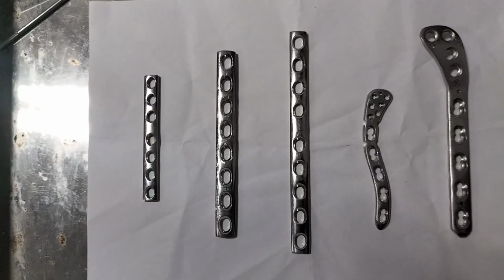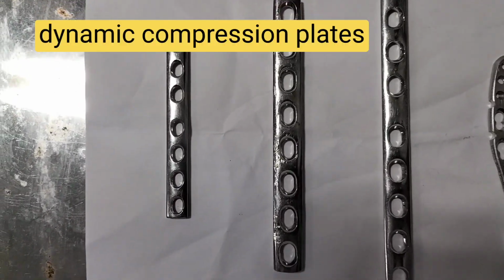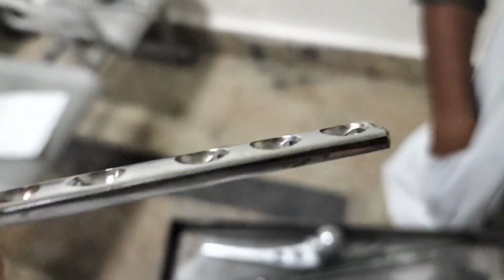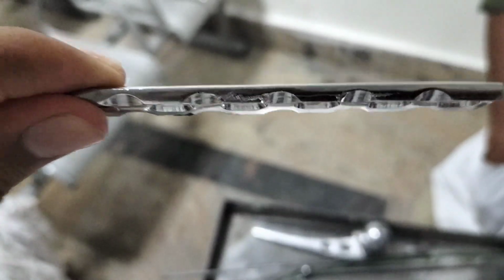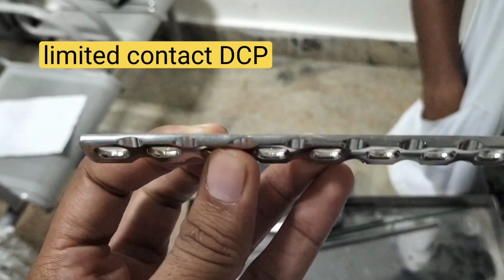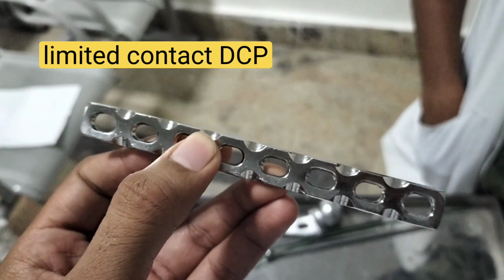Now coming to the compression plates. These three are the dynamic compression plates. If it is smooth ended and holes are present, this is a dynamic compression plate. But if there are some small bends like this, it is a limited contact dynamic compression plate. Why is this limited contact? It helps in easy and speedy healing of the bone.